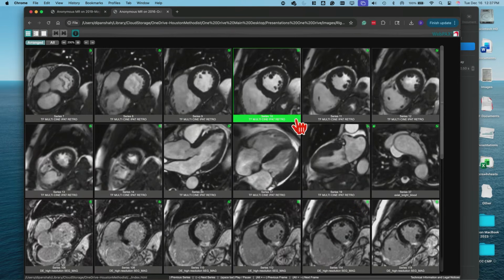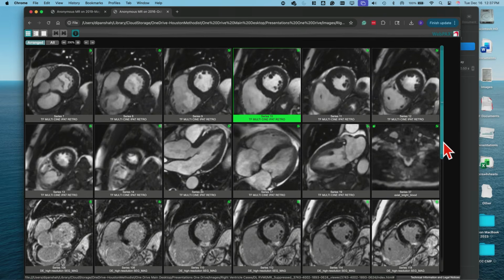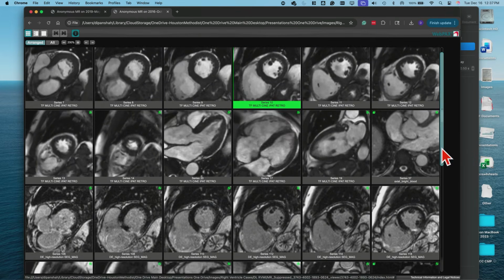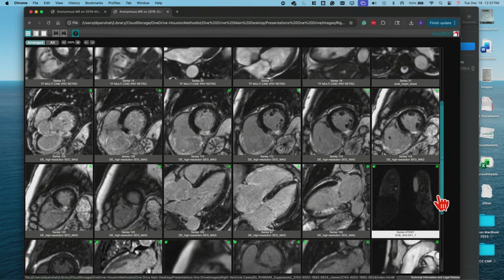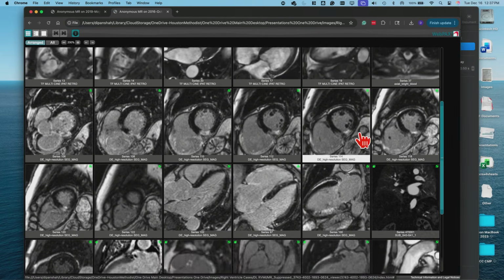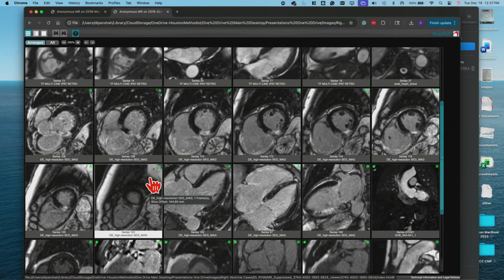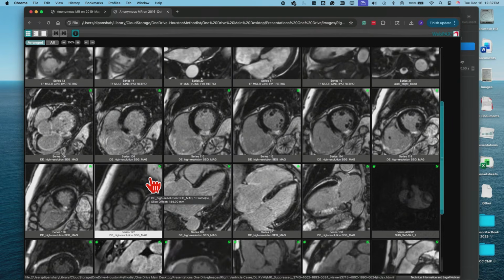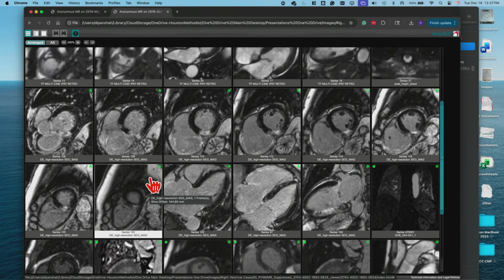So again, this is where MRI is useful. Besides assessing motion, morphology and chamber sizes, you also have this other technique, which is really the gold standard for looking for scar tissue and infarction. This is your late gadolinium enhancement, and what do you see here? And so remember, what you're looking for is bright areas. Bright areas represent scar or infarct, right? And black represents normal.